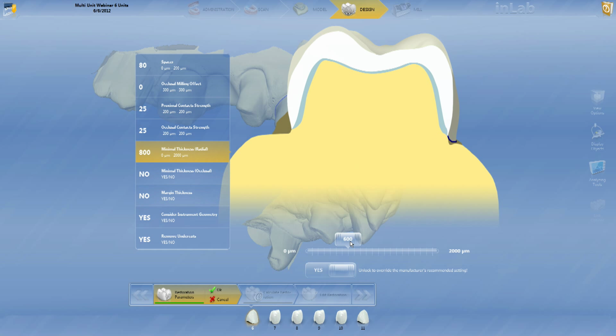Normally, I like to set the spacer, especially if they're Emax and stuff. I usually set it at 120. A lot of times, I don't really know if the doctor is going to bond it, or depending on how he wants. But unless he tells me differently, I usually keep it at 110. And of course, now 110 is 110. I know Jay hit up on that last week.